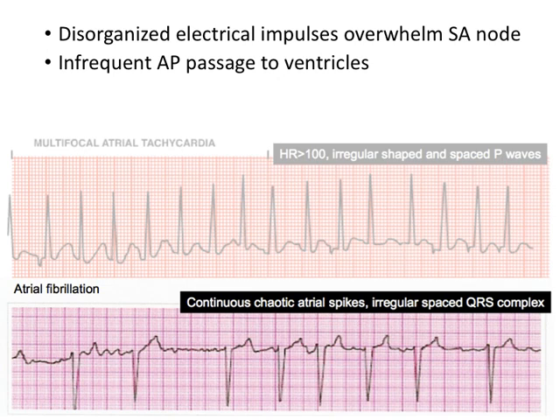There's infrequent passage, and we have obvious, at least S waves in the QRS complex that show ventricular depolarization, but the atria are in fibrillation here. There's no clear P wave and lots of just messy noise in the background. So no well-defined P waves.